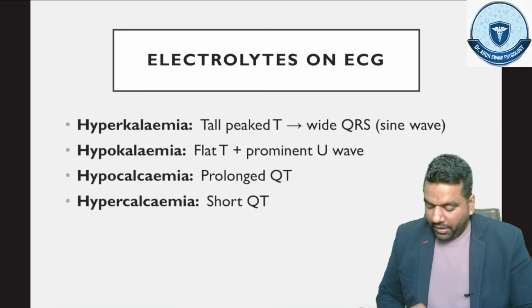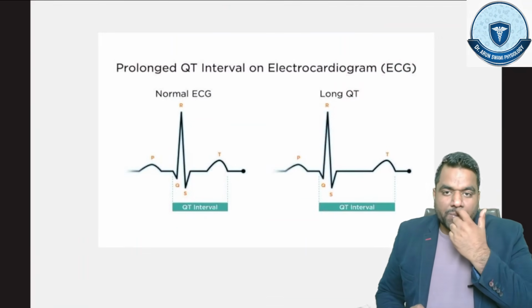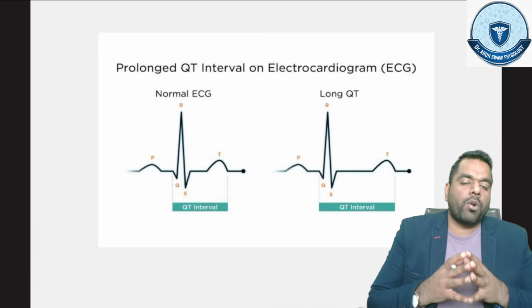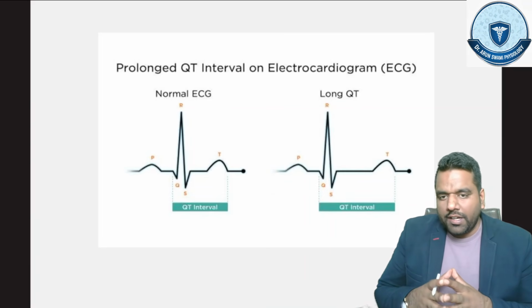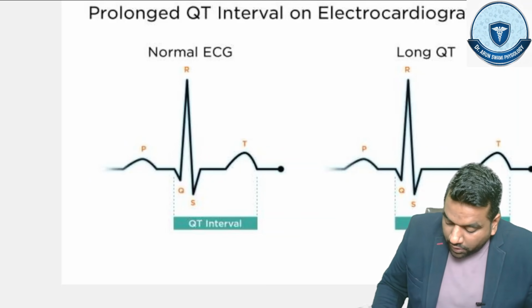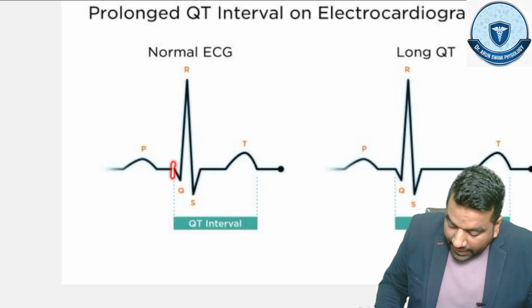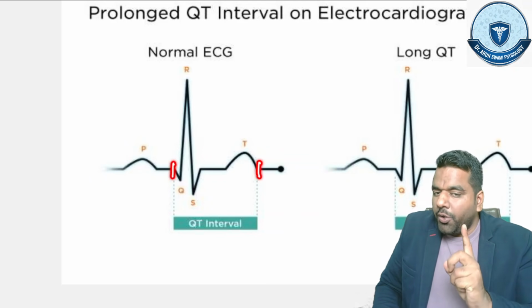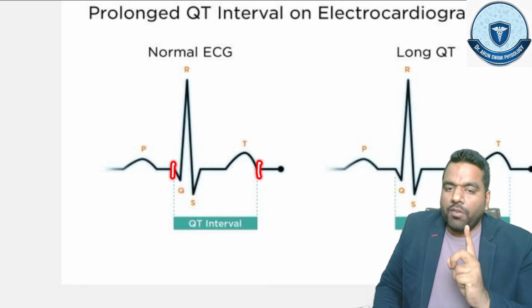Very, very important part. So guys, sometimes most of the students get confused, sir, which is the normal QT, which is the prolonged QT. Guys, the prolonged QT and the normal QT, you can see over here, this QT interval starts from the beginning of the Q and the end of the T. One more time, it starts from the beginning of the Q and the end of the T, that is your QT.